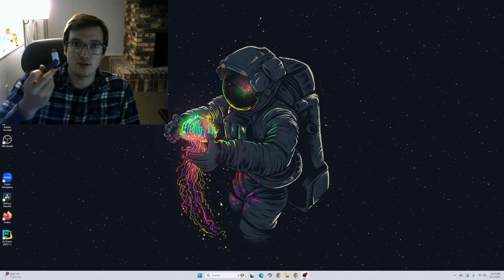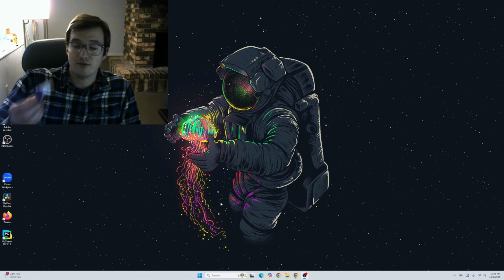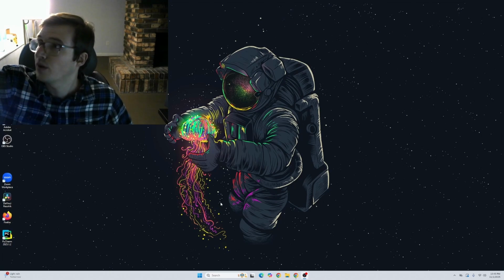But I have all of the data now on this thumb drive. So once we have the thumb drive, we can simply just load it into our machine. So I'm going to plug this in.